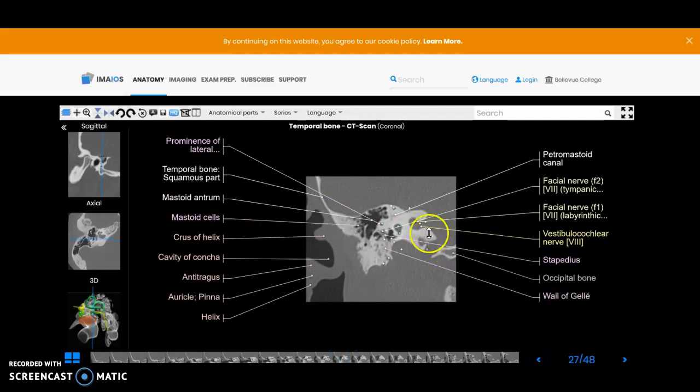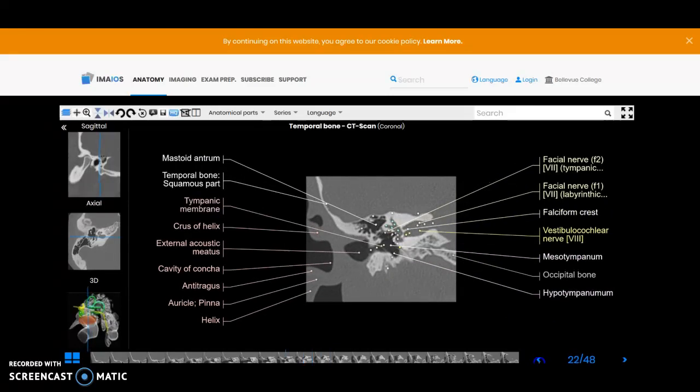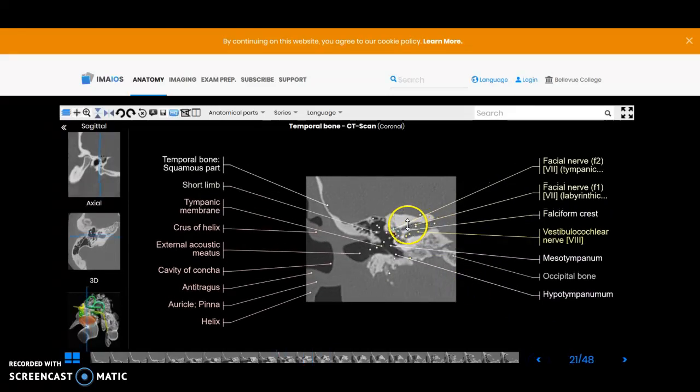And now we're coming into the 7th and 8th nerve as they start to course laterally. There we go. That's a more familiar image where you've got the 7th nerve superiorly and the 8th nerve inferiorly, and then the branches off to the side that I sometimes refer to as sort of like the little jester hat, with the tips coming off of the sides of it. And now we're going to be working our way into the cochlea here.